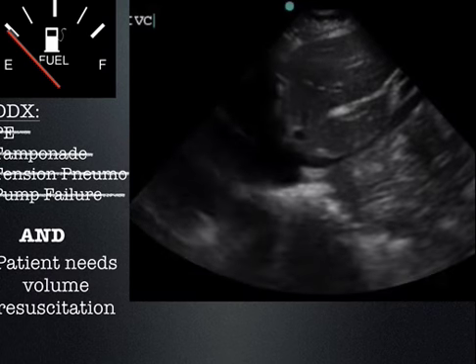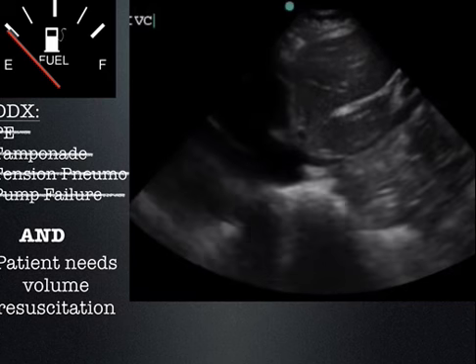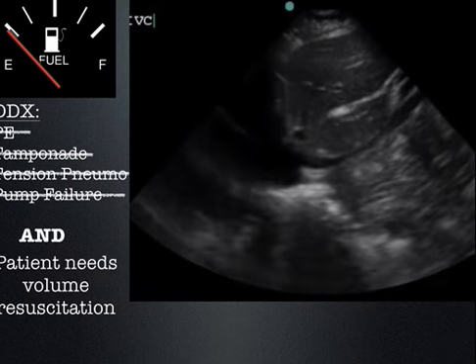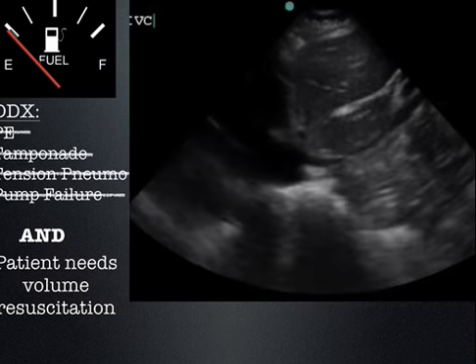We also know, just from that image, this patient needs a large volume resuscitation. So we're not doing 500 ml aliquots just from this image. We're saying 3 liters of crystalloid. And we're going to keep looking in the back of our mind, using our clinical integration, this patient may need blood if we find a hemorrhage somewhere. Okay?